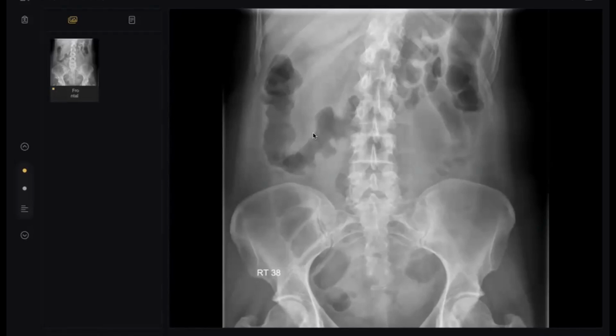The outer surface of the colon is called haustra or haustration. But this here is the haustral fold, because it is a little bit confusing. So this is a haustral fold, but the outer surface of it is the haustration. Here, what happened? Thickening, giving the fingerprint appearance. Very obvious in the transverse colon. By the way, the sacroiliac joint, doctor, is healthy. Normal. No problem.